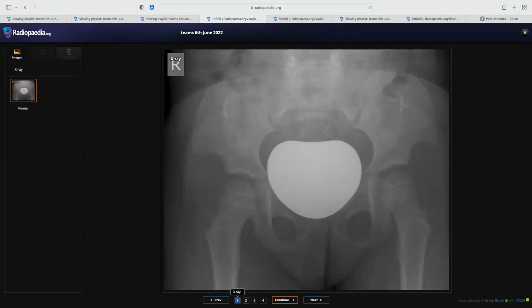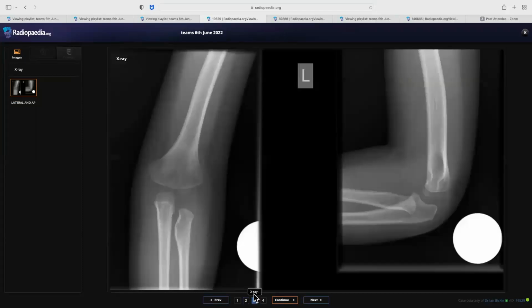Now you will know because Nail-patella syndrome, they have asked and they do ask. So those are posterior iliac horns. I think that's also quite obvious in this radiograph. It doesn't have horizontal acetabular roofs or achondroplasia that you were thinking of, but this doesn't look like that. And this one is the hypoplastic radial head. That's okay if you don't know about hypoplastic radial head, but at least when you see this radiograph, you can say there is something wrong with the radius. The radius looks abnormal, disproportionately small or dysplastic or hypoplastic. Something you can say, at least tell that it is abnormal.